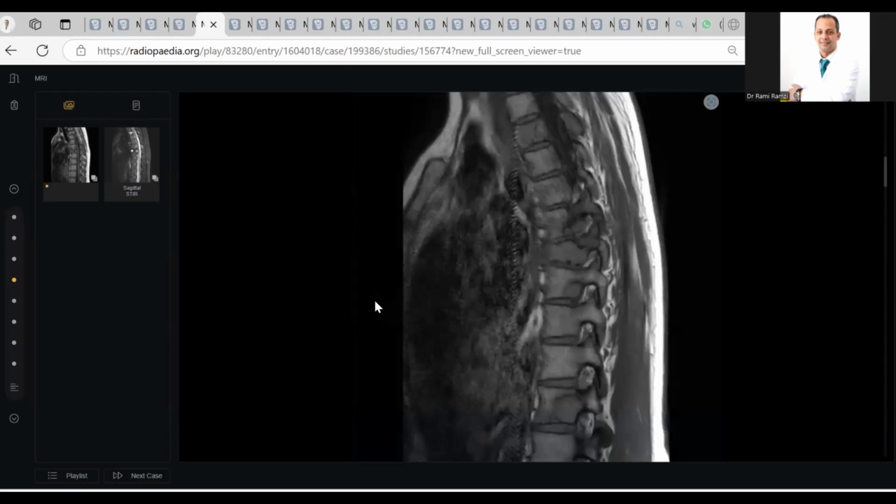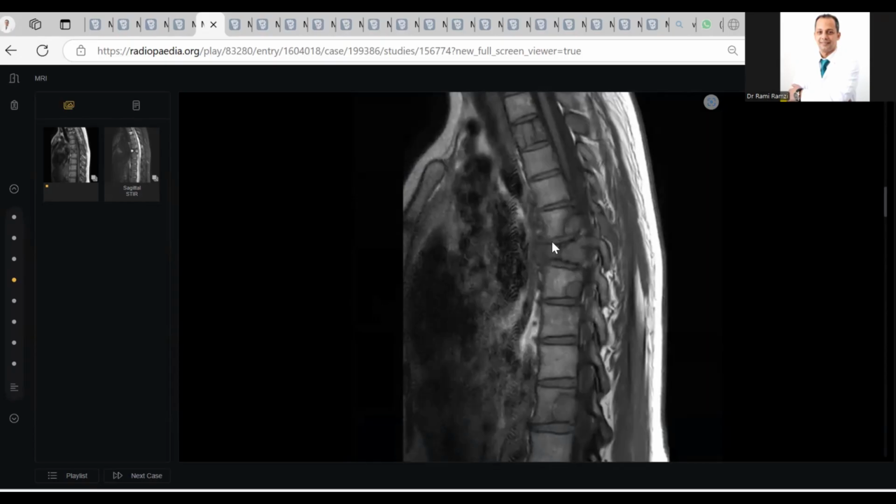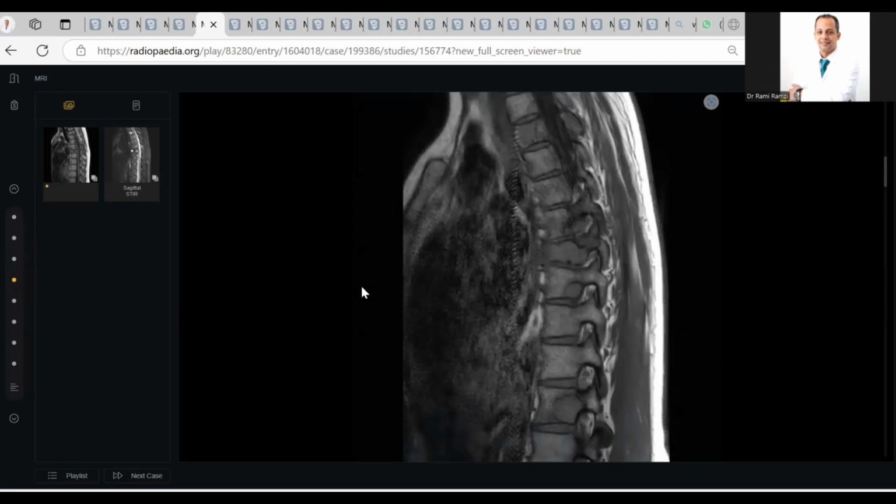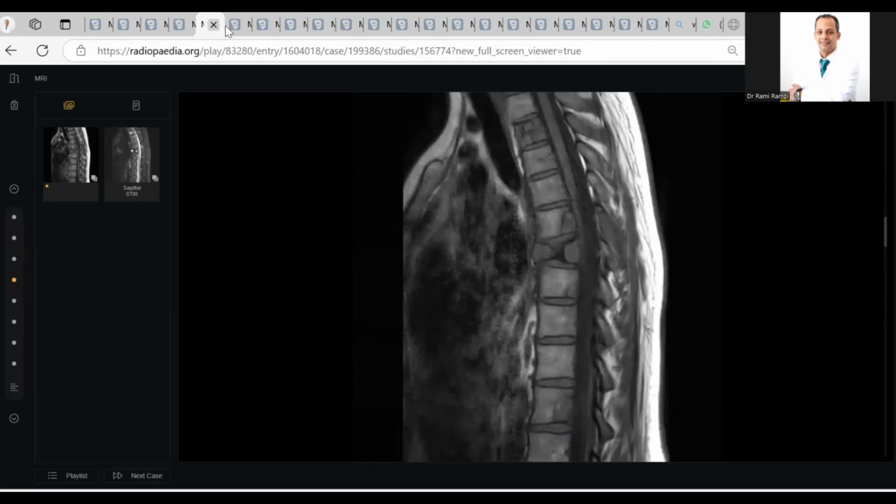Yes, give me some differential diagnosis. Yes, you are in the correct pathway. What is the other differential diagnosis? Other than metastatic, according to this sclerotic rim, the fibrous dysplasia can be one possibility. More than excellent.